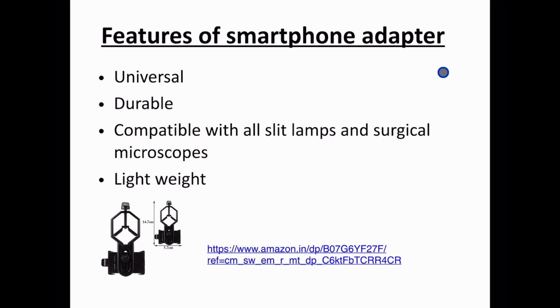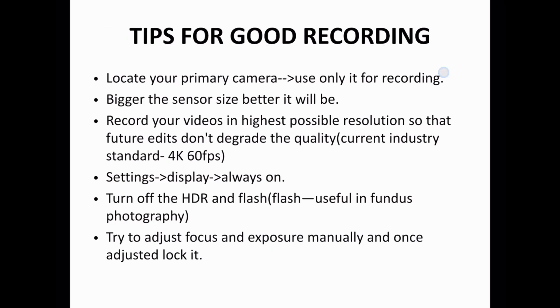Now, here are my tips for good recording. First of all, you need to locate your primary camera. These days, a lot of smartphones come with a complex camera module where they have provided multiple cameras, for example, telephoto lens, wide angle, macro lens, etc. So, research your smartphone and locate your primary camera and use only it for recording, because this is the camera with the highest possible resolution and biggest sensor size.